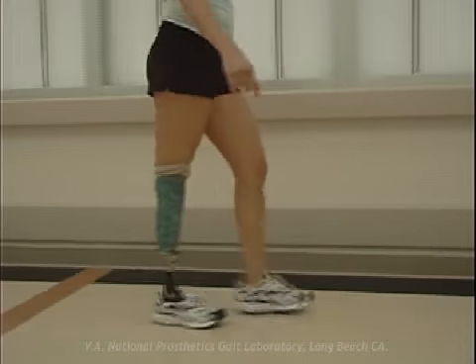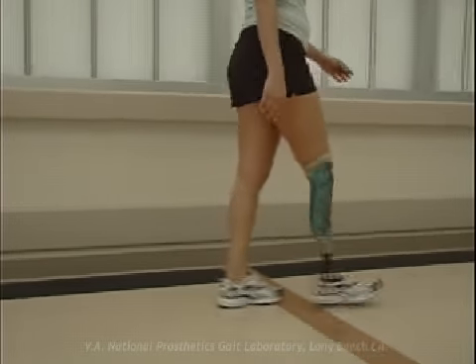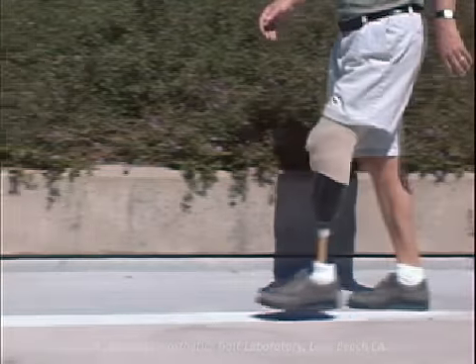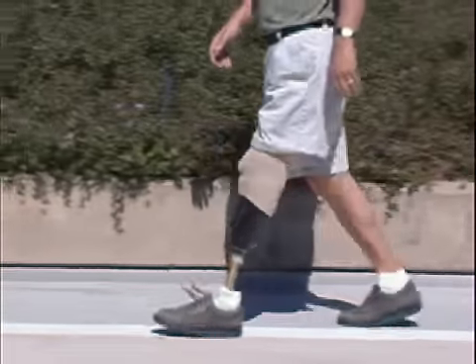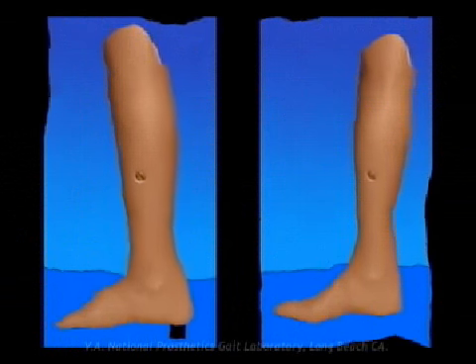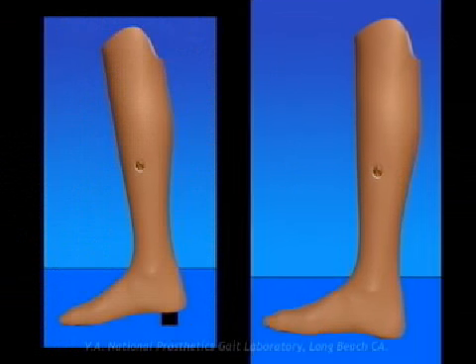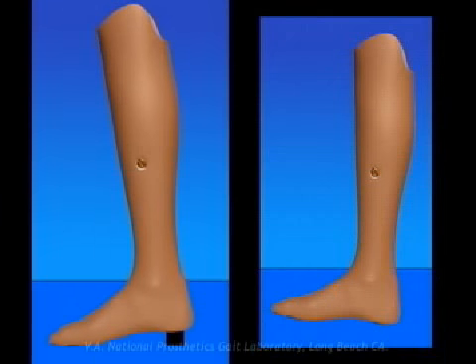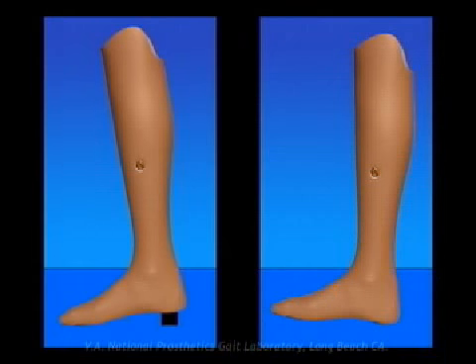It may result from a forefoot lever that is too long or too rigid. It is also seen when insufficient dorsiflexion or neutral alignment has been placed in the ankle of the prosthetic foot. Delayed progression can also be caused by a patient wearing a shoe with a lower heel than that for which the prosthesis was originally designed, such as sandals or negative heel shoes.